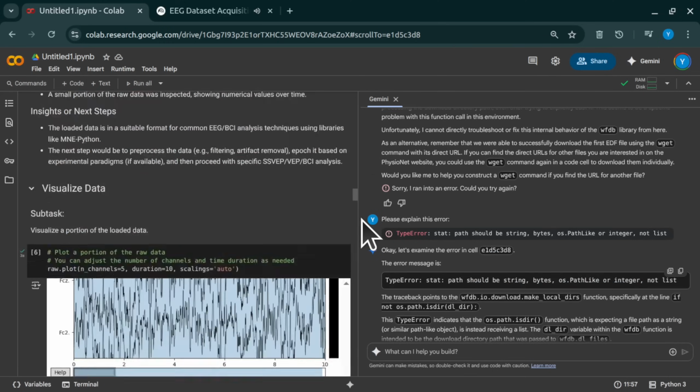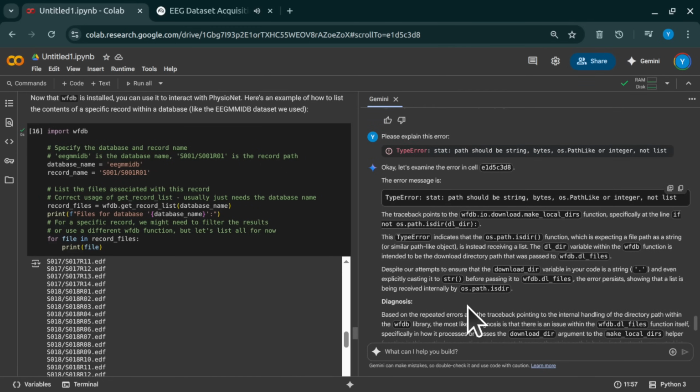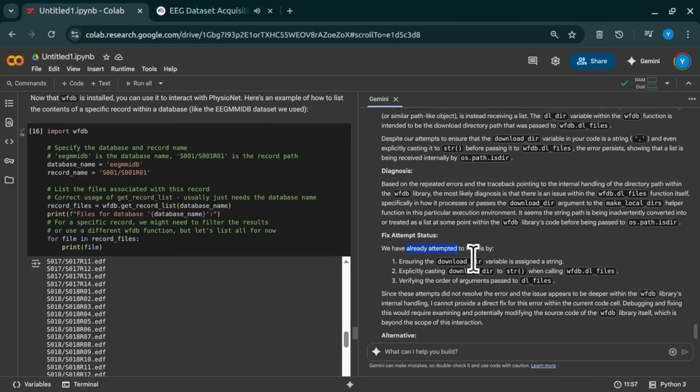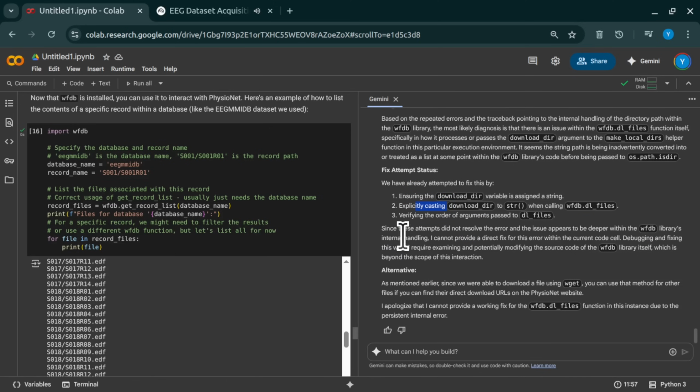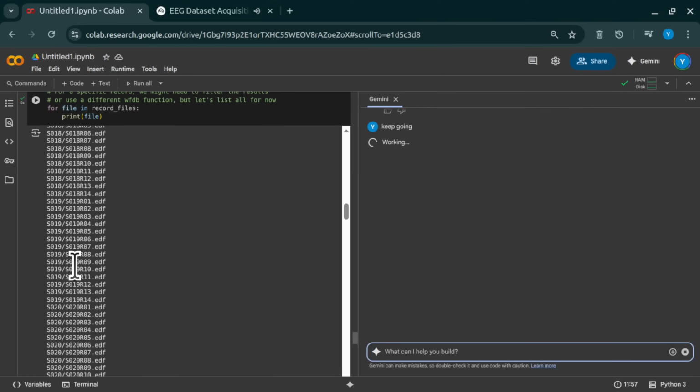It basically confirms the file follows a recognized standard for biological signal data within that EDF structure. BioSig itself is a whole toolbox for processing these kinds of signals. I see. So seeing BioSig-DF is like a stamp of approval. It means, okay, this is probably a well-structured file, and it should work with standard analysis tools, like the one we use later, MNE. Gotcha. So a little detour, but an important one. The solution was simple then. Rename the file from ssvdataset.zip to the correct name, S001R01.edf. Yep. Straightforward fix, but it highlights something crucial about working with real-world data, especially public data.